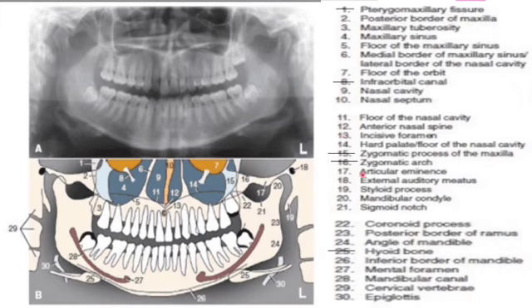Next, 19 is styloid process. Styloid process you will see on either side. So it is somewhere here. So this is the styloid process on either side and sometimes it appears to be elongated and we call it as Eagle syndrome. Next is mandibular condyle. I think that you can visualize well here. This is the mandibular condyle on either side of the radiograph.